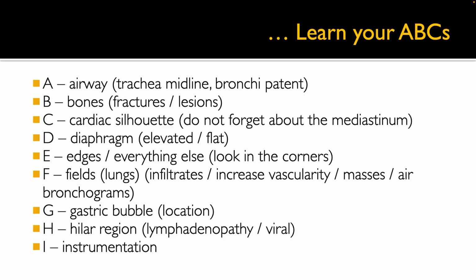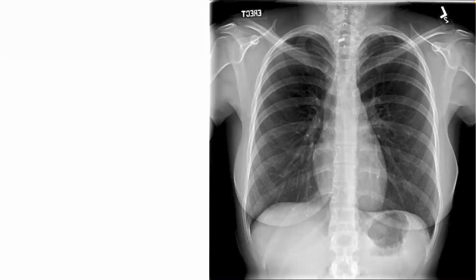And the final piece of it is the instrumentation. Is there an endotracheal tube? Is there an NG tube? Do you have a chest tube? So anything from that standpoint. So let's actually look and dive into each one of these pieces here.